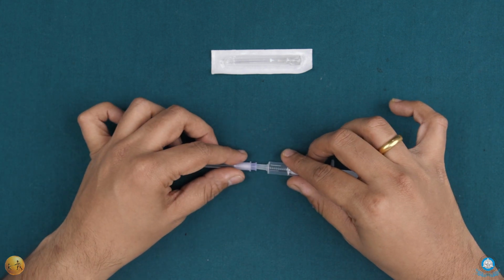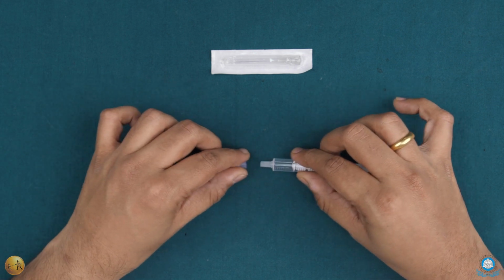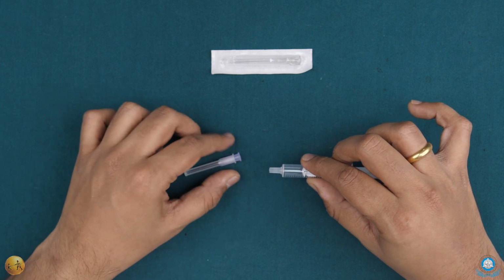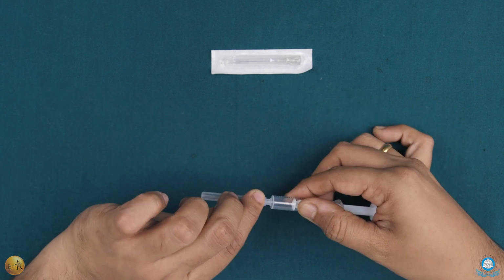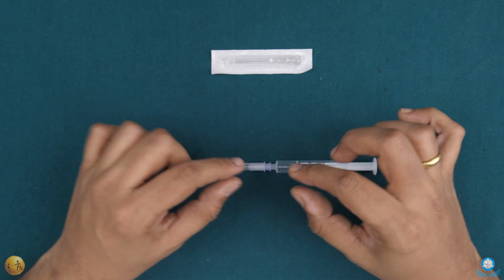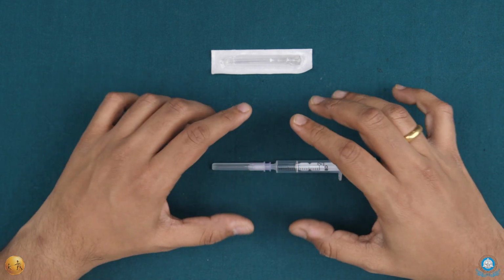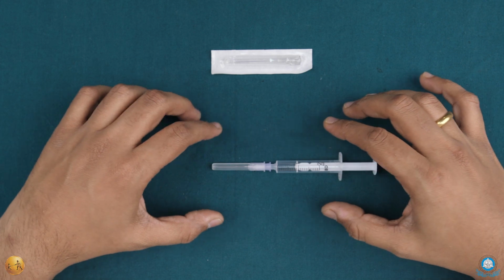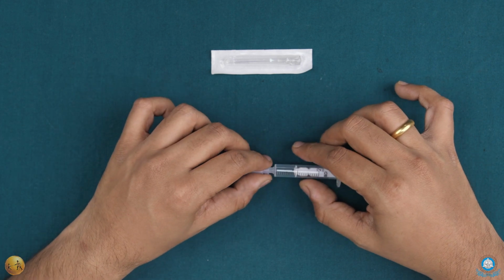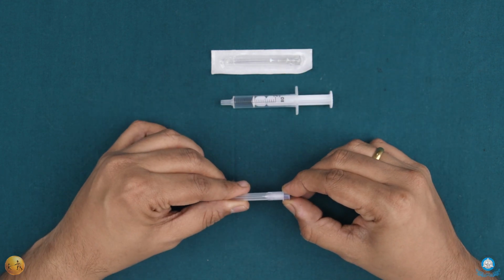Now, similarly, there is another system called a luer lock system. The luer lock system basically contains a screw thread around the adapter, wherein the needle gets locked into the screw thread when you engage it. That prevents accidental dislodgement of the needle while injecting. It is a more secure method of adapting the needle onto the syringe. Now, with this basic in mind, let's move on to the actual needle itself.